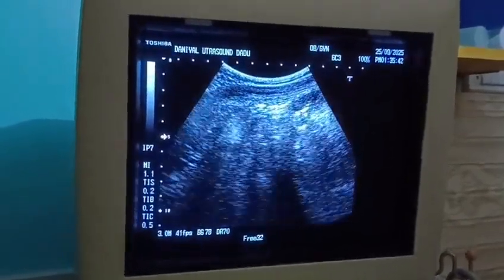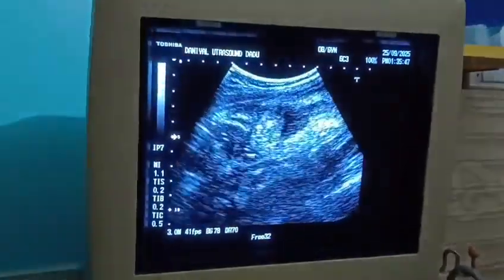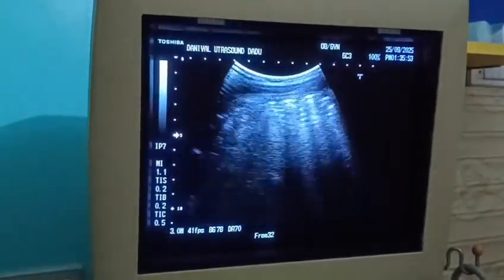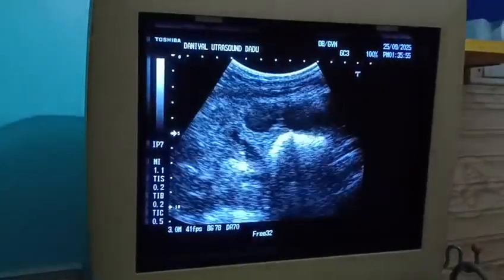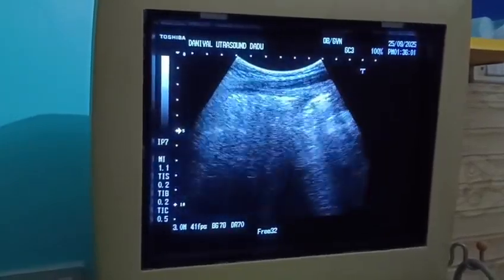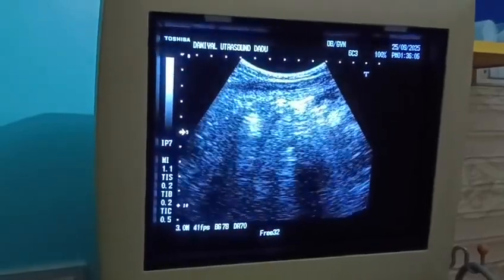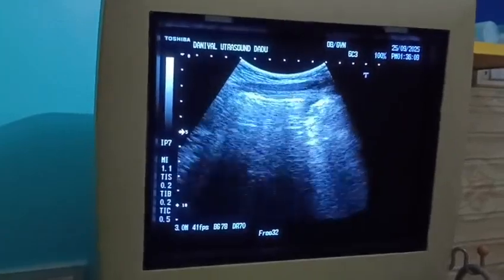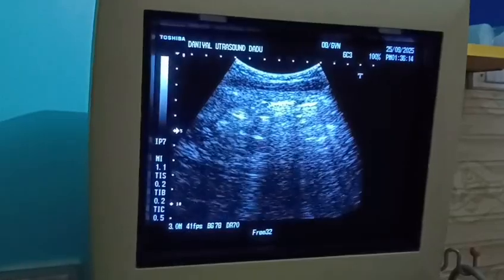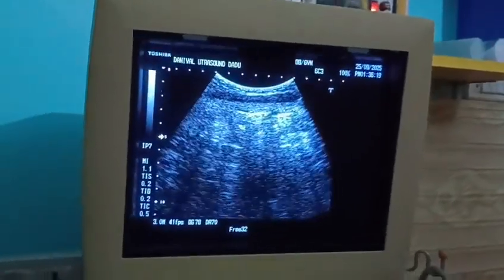Today we are going to discuss intestinal perforation, which is the most common pathology we receive time and again. So I thought it's suitable to repeat a few things which are very important, because intestinal perforation is quite tricky to pick up on ultrasound. But there are some well recognized features. So let me describe a few features that indicate the presence of intestinal perforation.